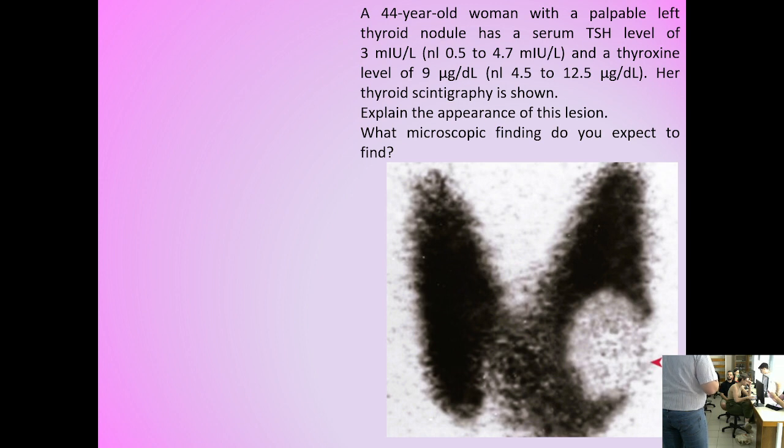When you have a cold area, it's easy because that is white. But as you asked me, if you have a normal thyroid and a hyperfunctioning thyroid, they both look black. However, if it is Graves' disease, the size of the gland is bigger. And this could be a criterion for you to discriminate between these two entities, normal and hyperfunctioning in the context of Graves' disease. Do you see scans in your normal everyday practice?